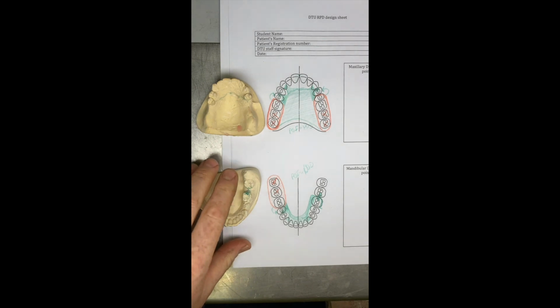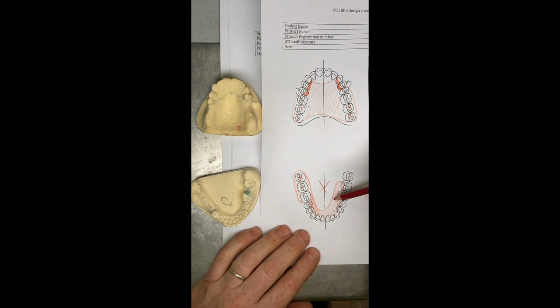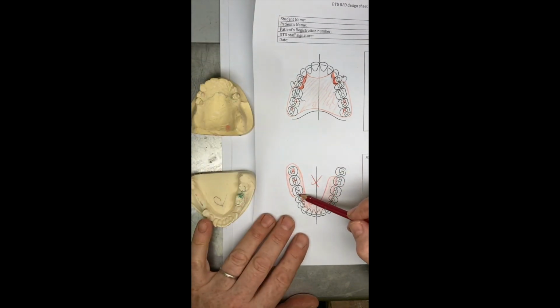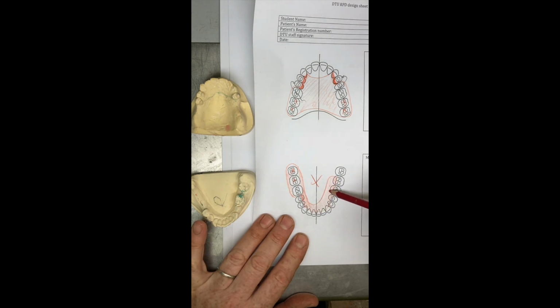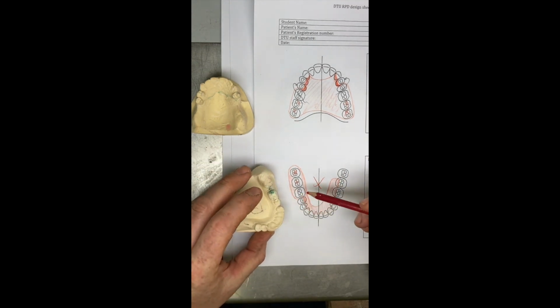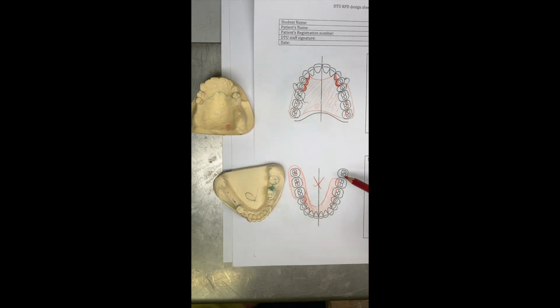For a mucosa borne design then, really challenging because we've got very little surface area on which to sit our mucosa borne denture. So we've got our saddle area here just the same. If we wanted to bring our denture around to this side of the arch to create bracing and retention and support, we've got no supporting area around this side of the arch, so we'd have to try and bring the acrylic work up to and above the survey line on all these teeth, and still you'd be very limited with the amount of support that you get. So really this isn't a workable option. A mucosa borne denture in this situation just isn't really feasible.